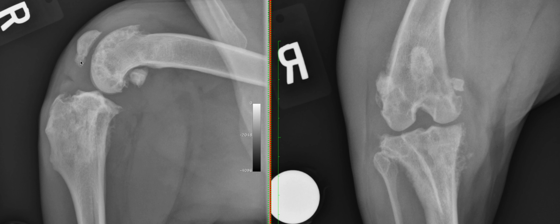So this new bone, the fact that it's quite irregular, it's definitely showing the sign that it's quite active new bone, and sometimes what we call aggressive new bone production, which is quite rough in aspect compared with smooth new bone production that we usually see in case of osteoarthrosis, for example.